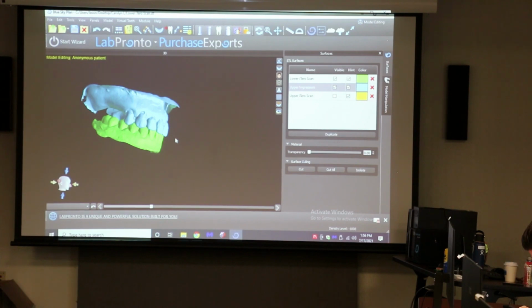It'll just tell you can't do it. That's a good question. Don't know. You could try it. Automatic's not even an option in there. Oh, it isn't? I guess if you went to model. It's because you don't have a DICOM in there.